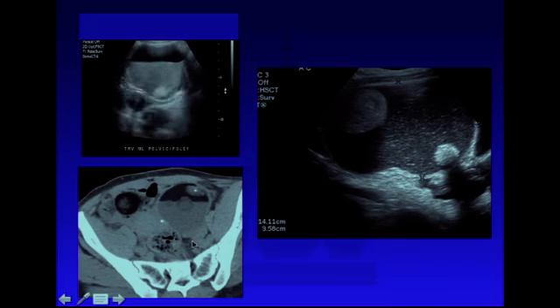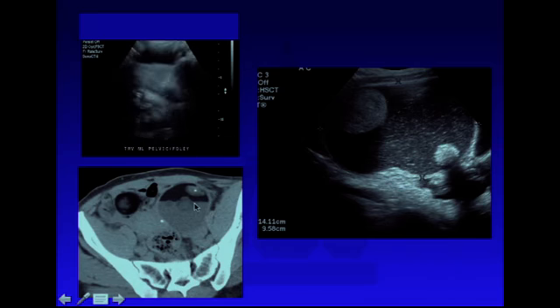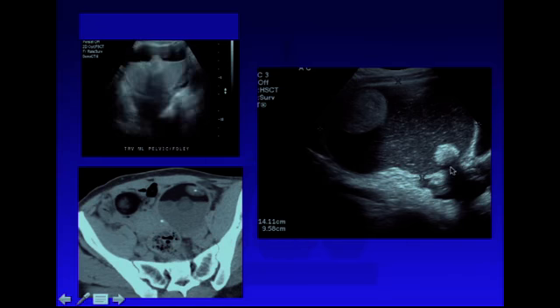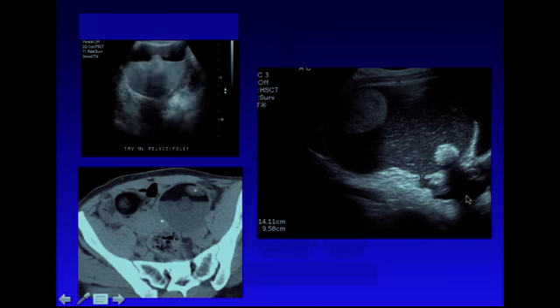And this is a CT scan in that same patient. The patient actually had bilateral cystic teratomas, and again, the fat-fluid level. And another example, a younger patient, again a large echogenic mass. This is a large cystic mass with internal echoes and an echogenic mass with shadowing.